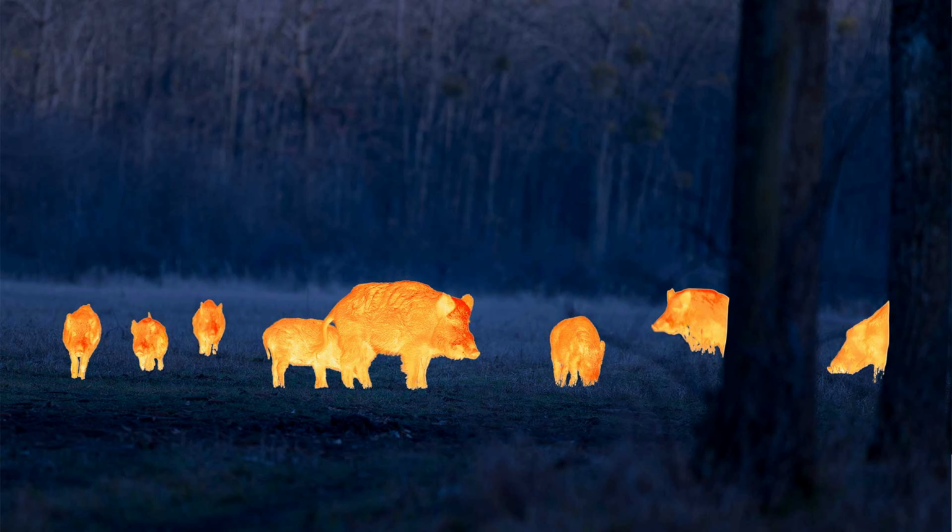Imagine you are standing in the middle of a forest, like I'm from Siliguri, and close to Siliguri there is a lot of dense forest. Say you go and stand in the middle of the forest in the middle of the night. With your naked eye, you will probably see nothing. It will be all dark like we are seeing here right now. But if you have infrared goggles or a camera, and you put that on, then probably you will start seeing so much wildlife around you.